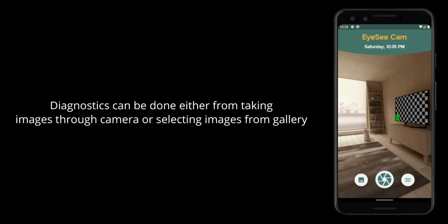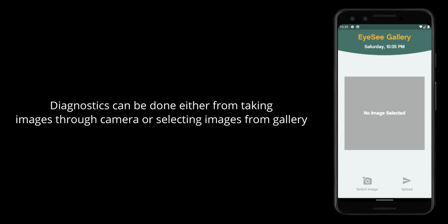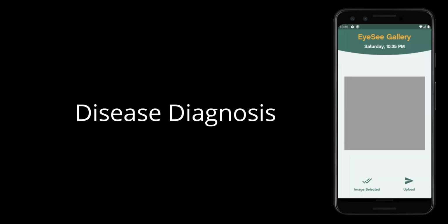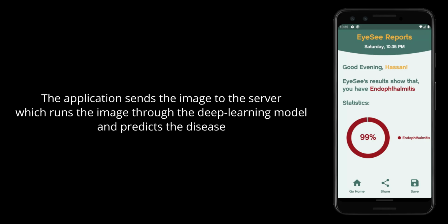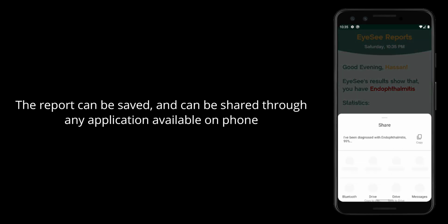Diagnostics can be done either from taking images through camera or selecting images from gallery. The application sends the image to the server, which runs the image through the deep learning model and predicts the disease. The report can be saved, and can be shared through any application available on phone.